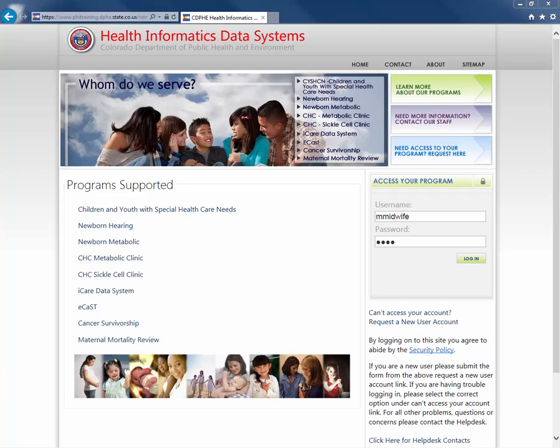We've designed this video for those professionals who are responsible for submitting hearing screening data to Colorado per the recommended Newborn Hearing Screening Guidelines. In this third training video in the series, we'll review common reasons why a baby does not appear in our Newborn Hearing database. And secondly, how to create that baby's record and mother's record, so that you can create the hearing screening results as described in our hearing screening module number 1. So with my browser set to the login page of our training portal, let's go ahead and log in.